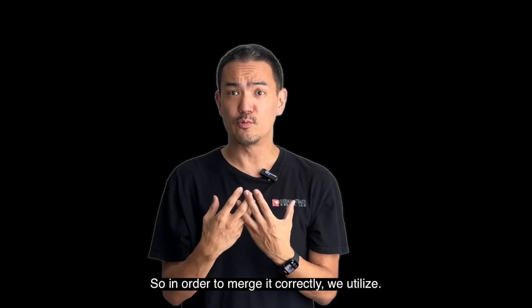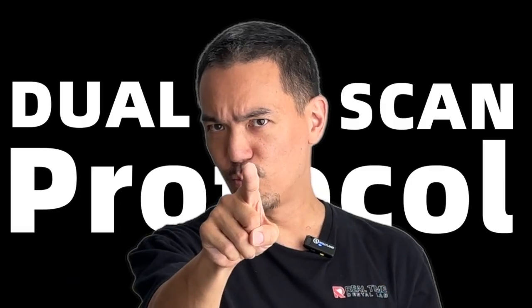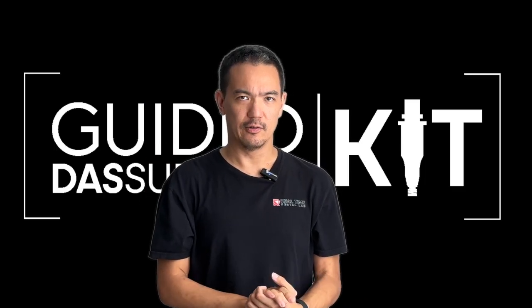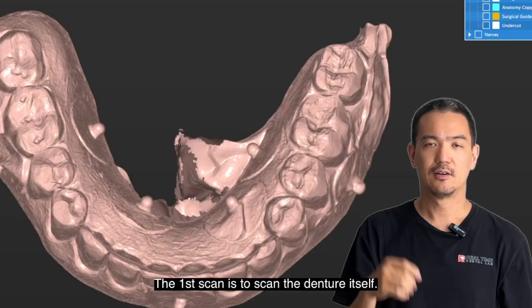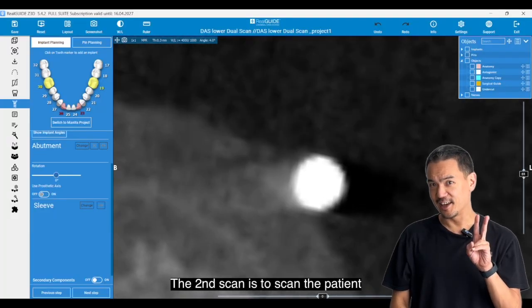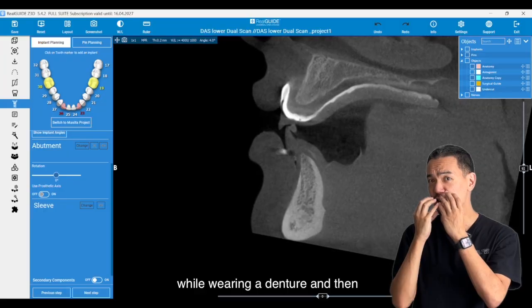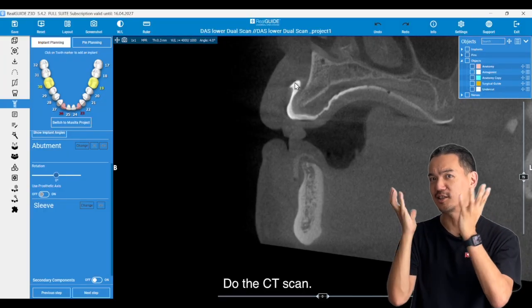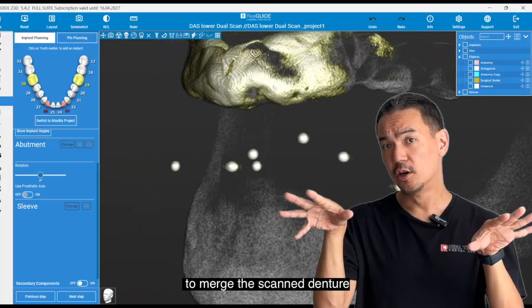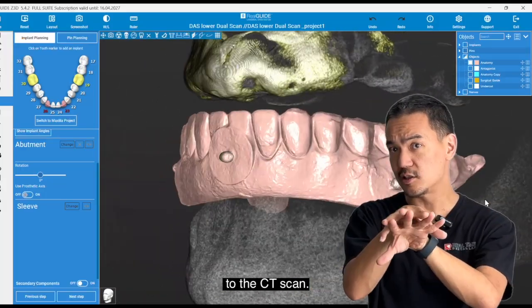So in order to merge it correctly, we utilize the dual scan protocol. What is the dual scan protocol? It means you do two scans. The first scan is to scan the denture itself. The second scan is to scan the patient while wearing the denture and then do the CT scan. So we can use those radiographic markers to merge the scanned denture to the CT scan.